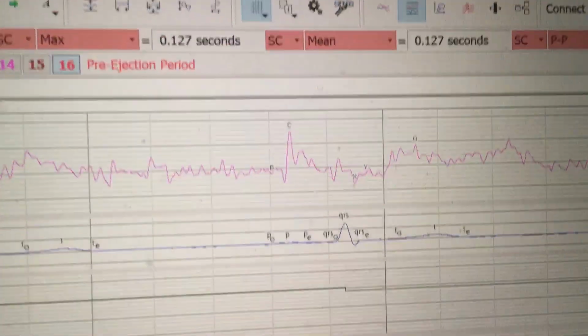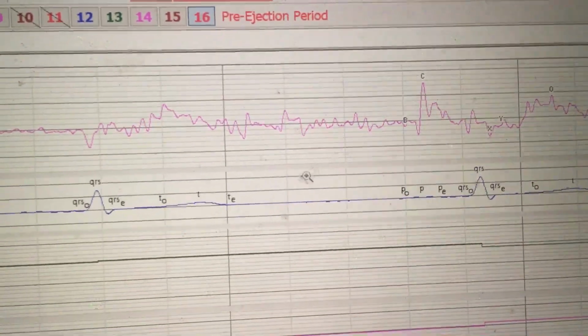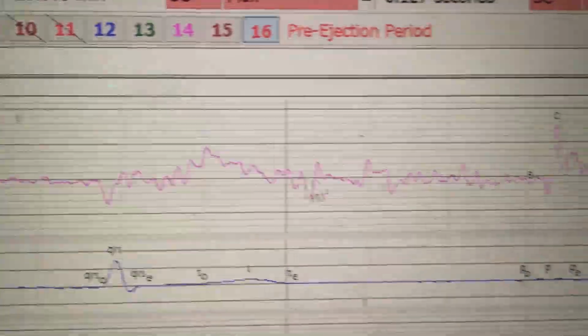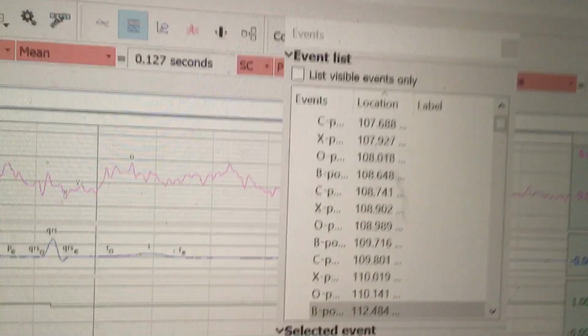I'm going to go up here and try to see what happened. Really, it doesn't look too bad. It must be back here somewhere. And so I just need to find where the problem is and fix it. Strangely enough, I must be missing something. I can't see a B that looks terribly off, so I'm going to go to my event palette. But before I do, I'm going to grab my arrow tool. I'm going to highlight a label that's in the ballpark so that when I go to my event palette, it should open to that event that I just highlighted, so I can kind of look around and see what's going on.